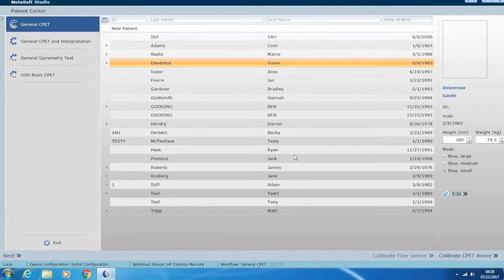If you did not have a person pre-installed or saved, please don't worry. What you can do is on the right-hand side where my cursor is now, where it says edit, that would say new, and you would just enter in their personal details. I won't show you that screen, it's literally just enter first name, surname, date of birth, and so on. So whichever you need to do is absolutely fine. So that's the person details.